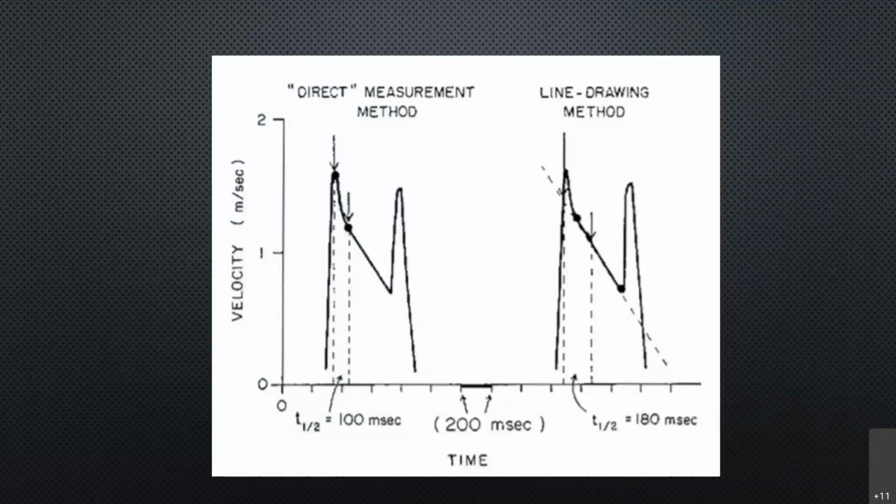Since I have John and Mansoor here, this is a question for the two of you, board-taking. So this is a continuous wave through the mitral valve. Which one will you take? The one on the left where you will draw your slope like that, versus will you take this one where your slope is more in mid diastole? Which one? And if you want to go for why, go ahead. It's the right one. Yeah.